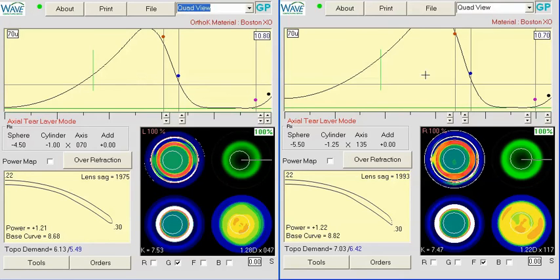So maybe just double check this second lens to see if it's an import or software glitch when the lens was designed, and accidentally had clicked on the wrong topography. But if you start with this lens, just like you did here, move the OZ and the IC out.